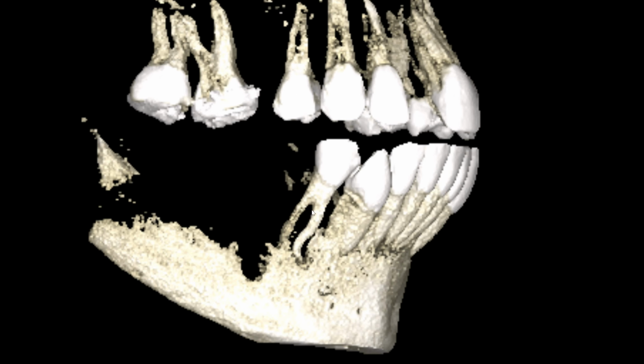So if you accidentally miss a single canal, then the prognosis of having a successful surgical outcome is now compromised, right? So you can see how important it is to take cone beam CT before doing a root canal, especially on a tooth with a possibility for root and pulpal canal variations.